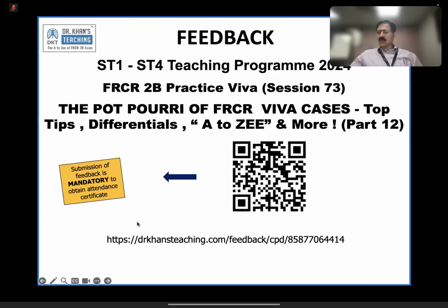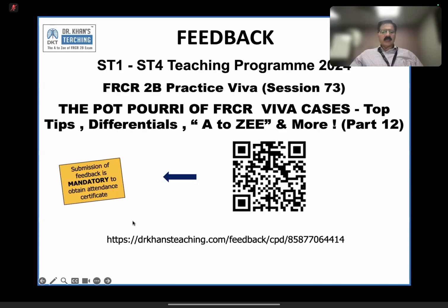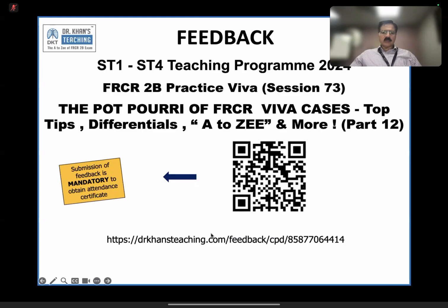Yeah, okay. So how do you differentiate between micro hemorrhages? You cannot differentiate between micro hemorrhages. Maybe both of them will show blooming artifact. So small cavernoma versus cerebral amyloid angiopathy looks similar, except that age or the clinical scenario will be different. So on SWI sequence, they can look similar.